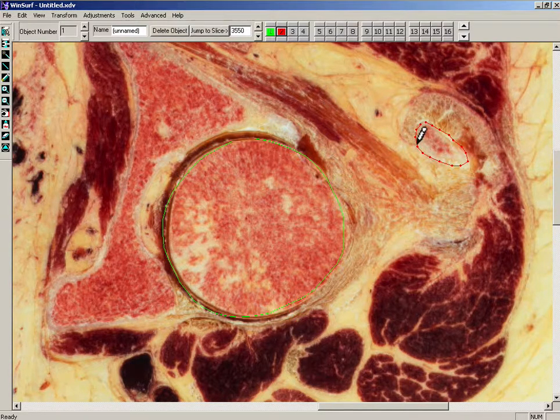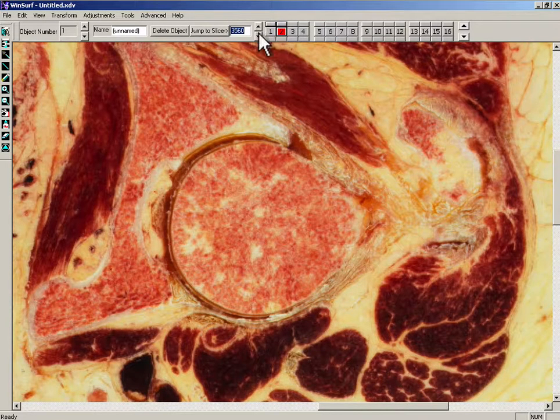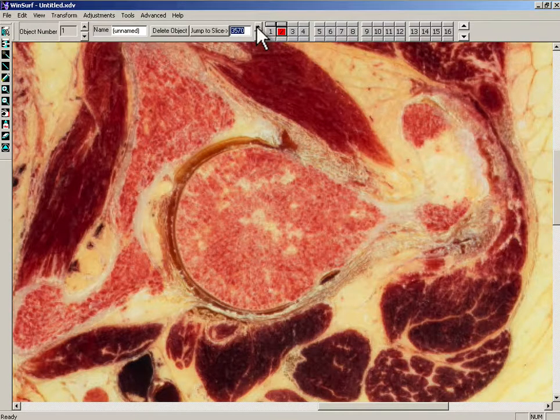Now, I have another structure which is beginning, but it is not related to the head at this level, so I should use a cap here on the top, which is indicating to the software that this entity is ending at this part. So now I go down again, 10, 2 times.